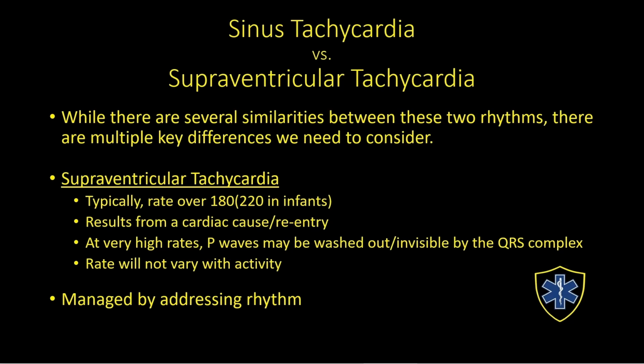In this case, we need to actually treat the rhythm. So if we look at that child I was telling you about that's been sick for a few days and having a bunch of GI problems, we say possibly hypovolemia, and we'll treat the underlying condition. On the other side of the coin, if the child's been just fine and all of a sudden out of nowhere we're seeing a strange rhythm like this, we say, that could be the heart doing it on its own, and therefore we would treat the rhythm.